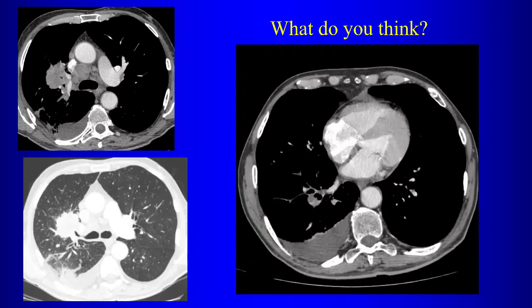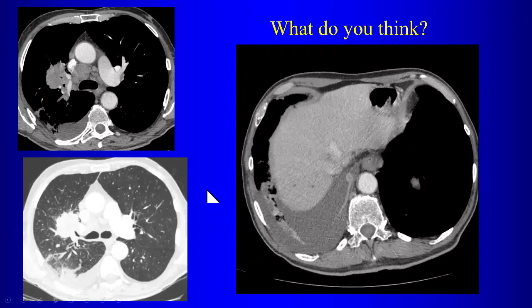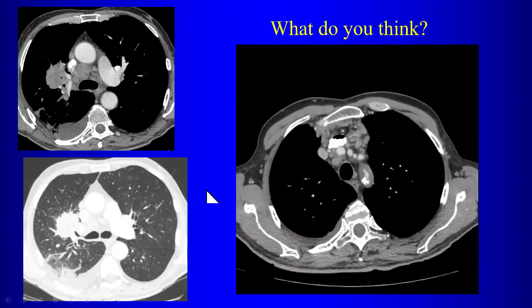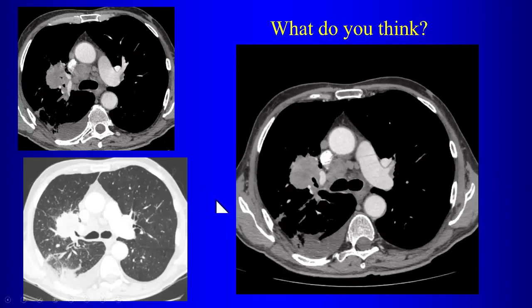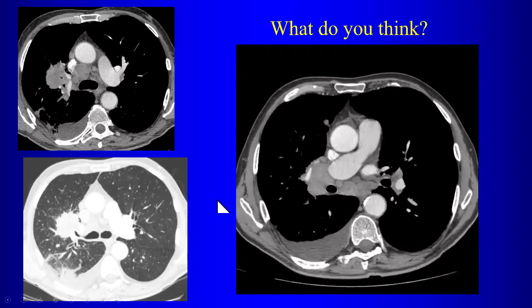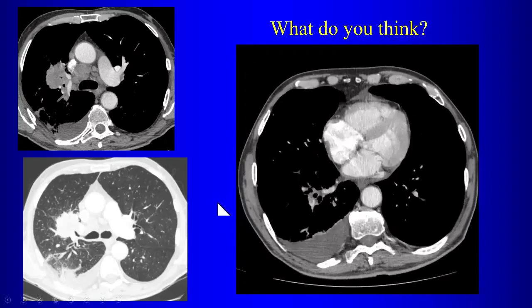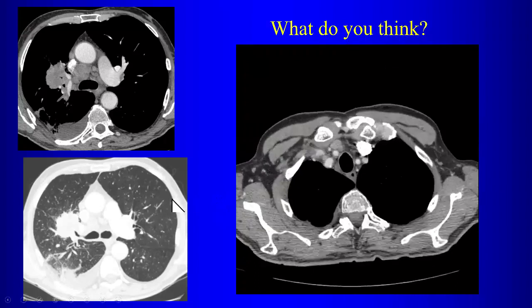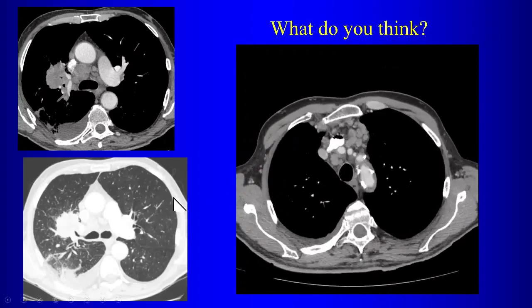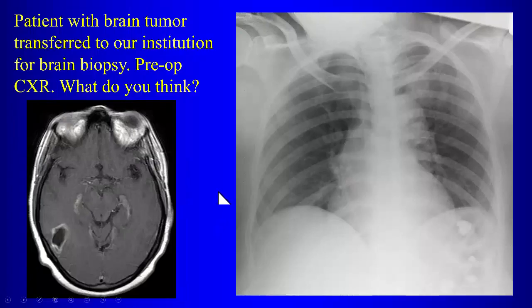In all patients with histories of cancer, when you're reading the CT scan of the chest, always have an index of suspicion for PE. Look very carefully at the vessels. They might be small like this. They could be relatively asymptomatic, although they will tend to treat the patient. The patient will get treated for the pulmonary emboli. So don't forget to look at the vessels very carefully, even though it is not a PE scan. You can still pick up these PEs on these outpatients.